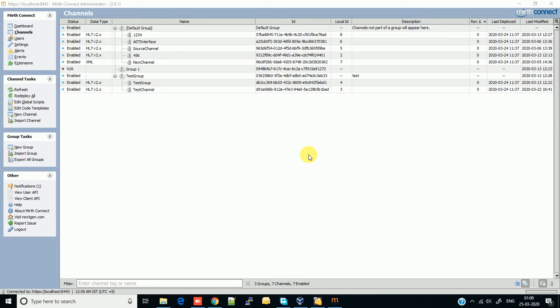So today we will continue our Mirth tutorial series and today we will see what is alert and how we configure alert in Mirth and why it is recommended to use alert in your Mirth channel. So let's begin. So first of all, what is alert?